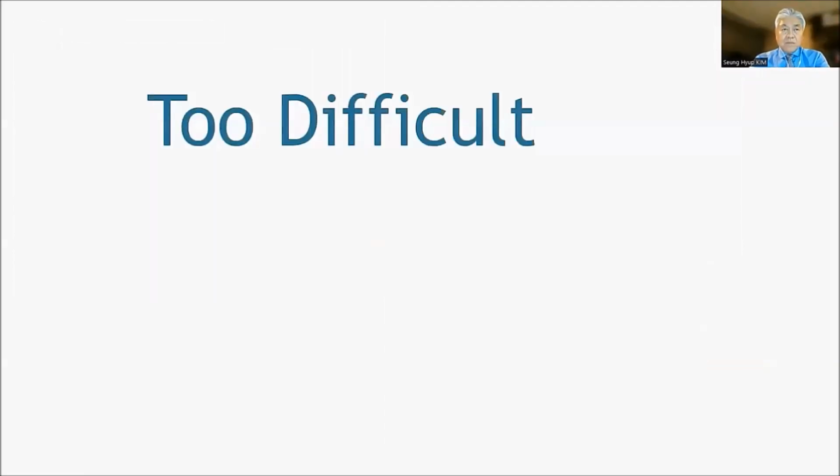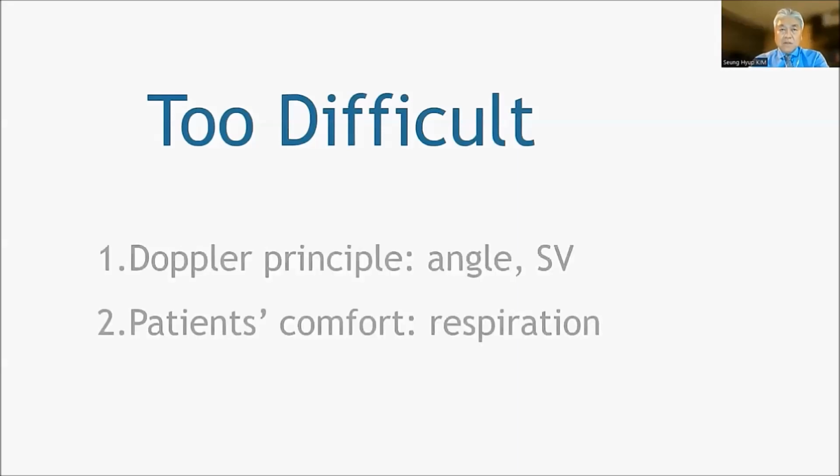Many people told me that Nutcracker Doppler is too difficult. I believe there are two reasons they have difficulty: number one, Doppler principles such as Doppler angle and sample volume were neglected, and number two, the patient's comfort regarding respiration was neglected.